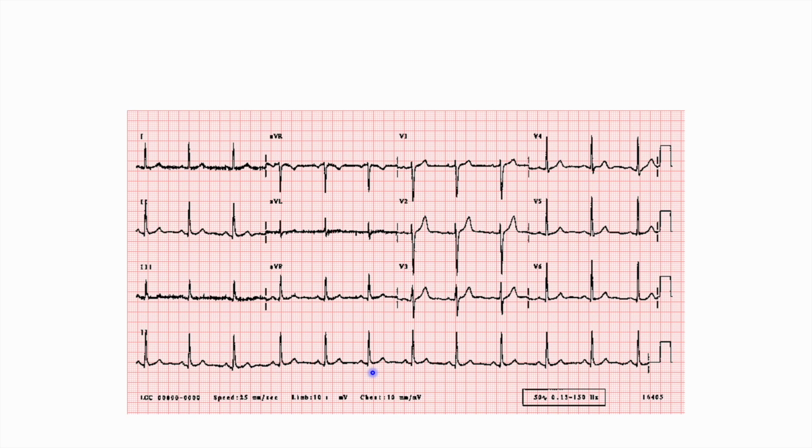So now let's move on to EKG Rapid Fire. The way this is going to work is I'm going to pull up an EKG, wait a second, and then I'll pull up the answer and give you a quick explanation. So if you want to try this on your own, pause the video once the EKG comes up and see if you can figure it out, and then see if you have the same thing as me. And so some of these are in order, some are in different order, so let's just get started.